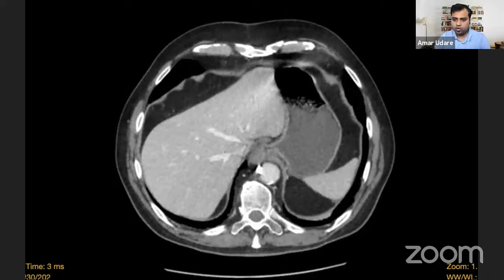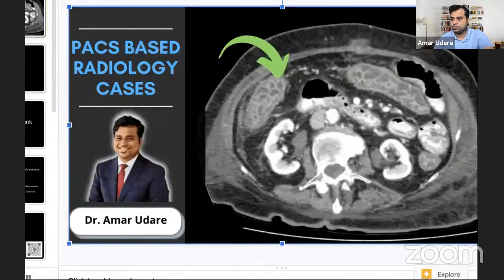So stranding of fat localizes. I'm not sure about your question. Maybe you can reframe it and I'll take it later. So Ram Kumar Varma, that's non-occlusive mesenteric ischemia, also known as NOMI. That's absolutely correct. So let's move on to the next case.